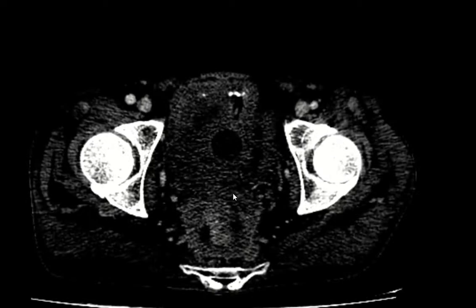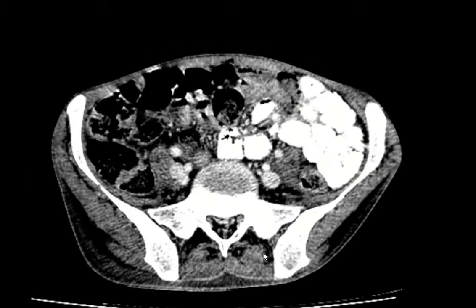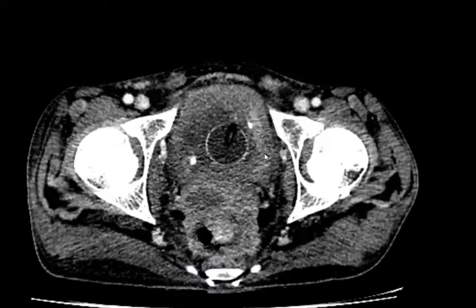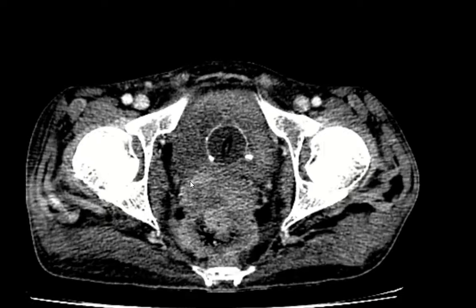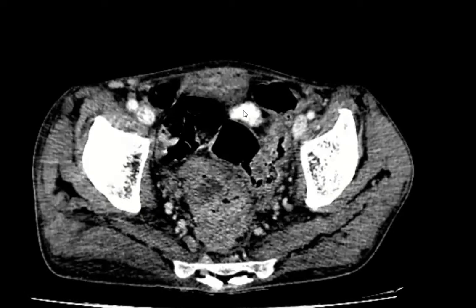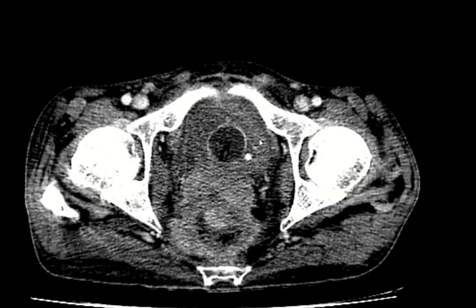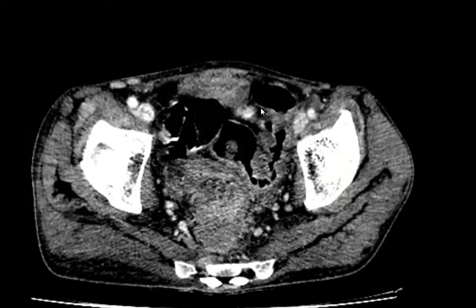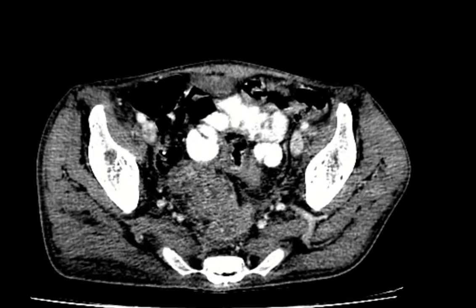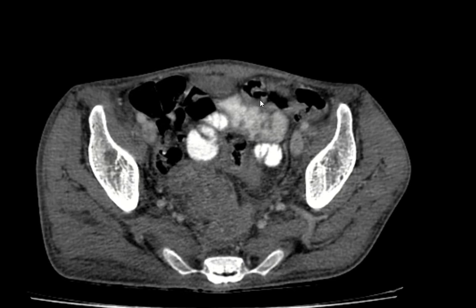Let me try to show you exactly what is happening in the urinary bladder by changing my window. What am I saying? I'm just going crazy around here. All right, so here you see there is a thickening of the urinary bladder going on, and you see the wall of that bladder is having this calcification going on there. Also on the left lateral side as well. Probably because of the abscess which is causing obstruction and that sort of thing.